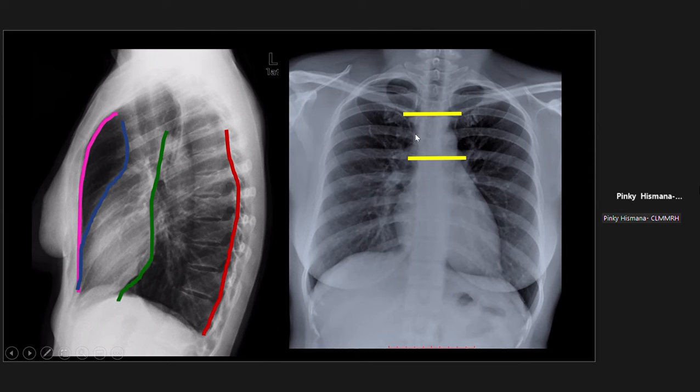Actually, this makes up the portion of the arc of your aorta, or your aortic knob. On the other hand, I'm sorry, the line should be lower. That would be at the level of T4. Yes, correct. I'm sorry. This portion here would now be your superior mediastinum.